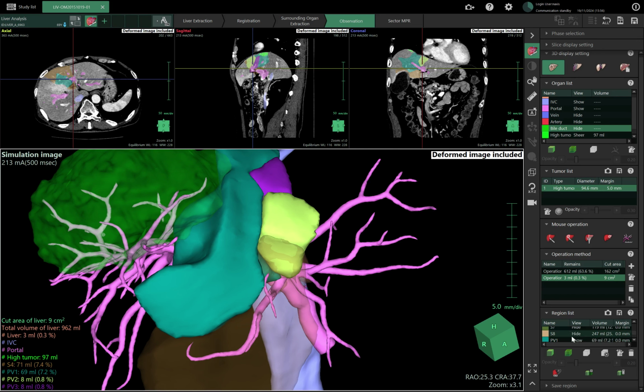other. As you can see here, the names are S1 to 8 because they are segments. These extractions I have made on my own by clicking on portal veins. I will see portal vein 2, portal vein 3, etc. So this, I will combine those two.